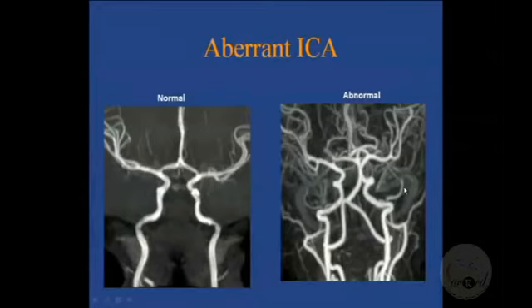Then you'll find it. But if you're not suspecting it, you'll miss it, or commonly miss it. Second, if the findings are symmetric, and in this case, it's very symmetric, our eyes are more sensitive to pick up the symmetric findings better or asymmetric findings better. Or diffuse findings, like if the bone marrow is completely diffuse, like leukemia, lymphoma. Sometimes you miss it because it's diffusely abnormal. Symmetric finding, diffuse finding, and the second finding.